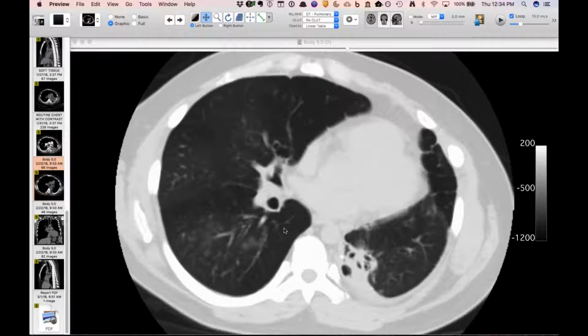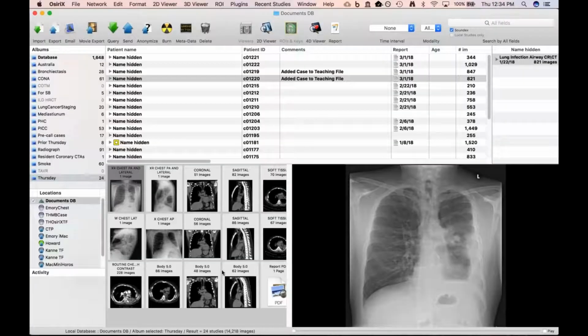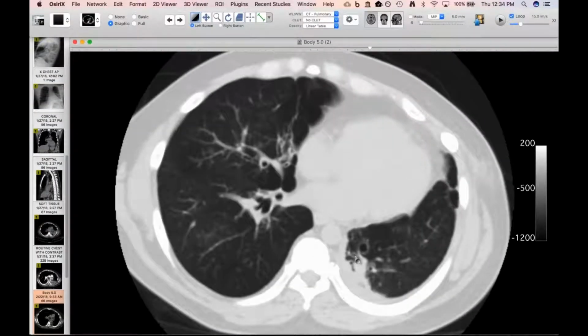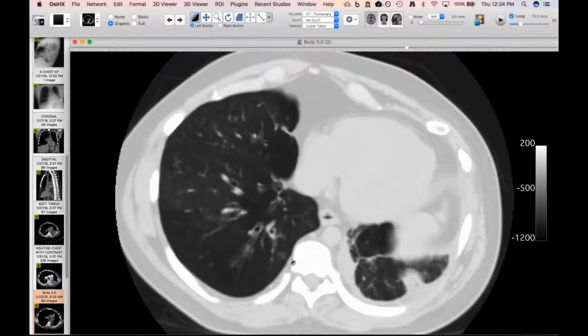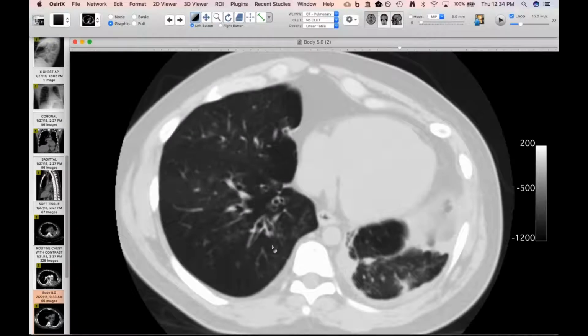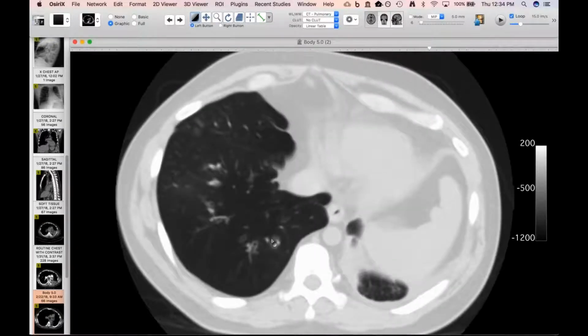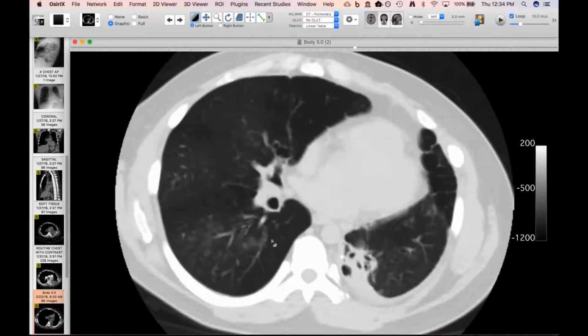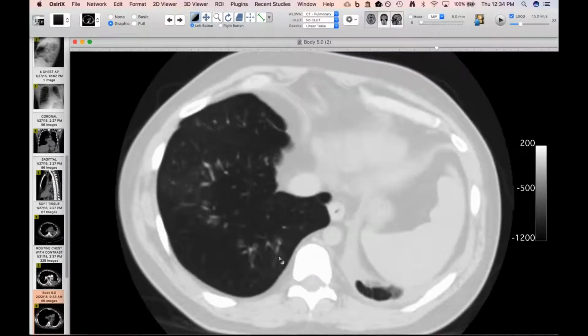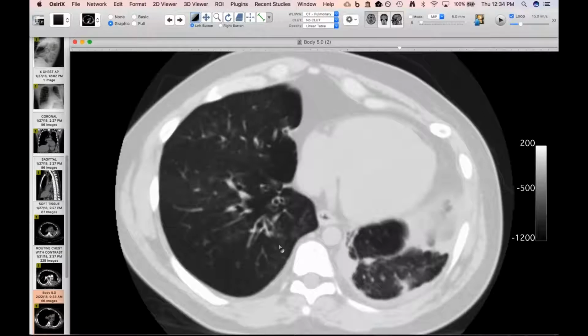No. Travis, do you think that he might have had an immune deficiency, though, that caused all those childhood infections? I mean, maybe they were recurrent bacterial infections. That's a very good question, too. I don't know. Yeah, if he had some sort of IgA or hypogammaglobulinemia or something, yeah. I think they're going to work him up further. But it's certainly not just asthma. Right. So, yeah, I think with this bronchial wall thickening and the bronchiectasis, certainly he deserves more evaluation. Definitely. Good idea.